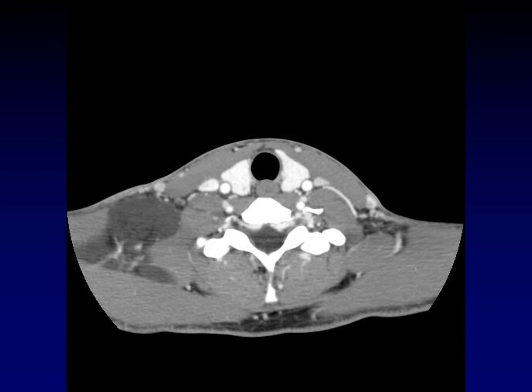Here's another example of a lymphatic malformation. Yes, most of this mass with an imperceptible wall is sitting in the posterior triangle, but look at it intercalate back between the muscles of the posterior neck, this infiltrative pattern. It's really benign, but this infiltration of this benign mass is what marks this as a lymphatic malformation. It doesn't care about wrapping around vessels. It doesn't care about wrapping around muscles. That's what marks it as a lymphatic malformation. It doesn't care about encapsulating the fat.